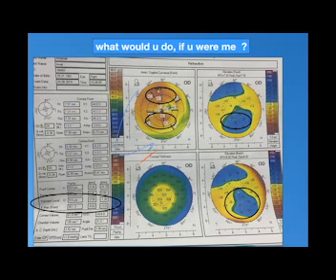The superior circle borders the highest points of the highest case: 51, 49, 49.5. The inferior, which is opposite to the superior, is 48 and 44.9, so far there is a high difference between both. Up till now, it's irregular, but I have a question from Dr.